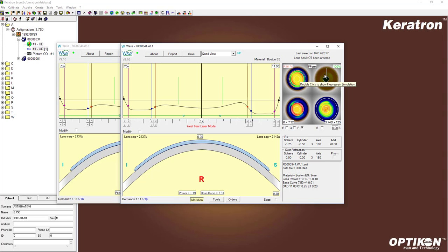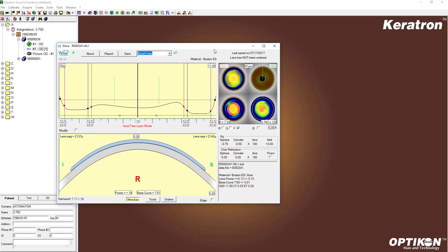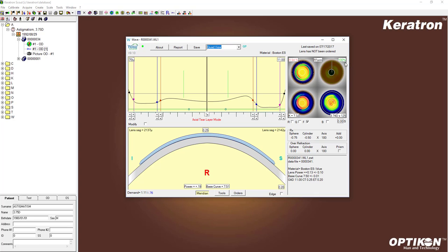There's something else that you need to be aware of. Okay, so let's say this. I'm going to go ahead and close this window. Let's say I'm designing a lens and I've got it in GSYM toggle. I toggle to GSYM. Okay, now I'm going to leave it there and go ahead and close the window.